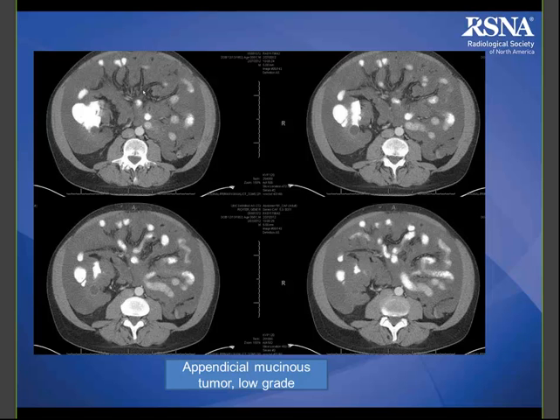For a lot of these patients, we're not giving the routine positive oral enteric contrast anymore, and so to even help you find the appendix can be really tough. But I think the oral contrast in this case really helps to show that, especially since the oral contrast isn't in the lumen of the dilated appendix, also makes you think that it's obstructed.